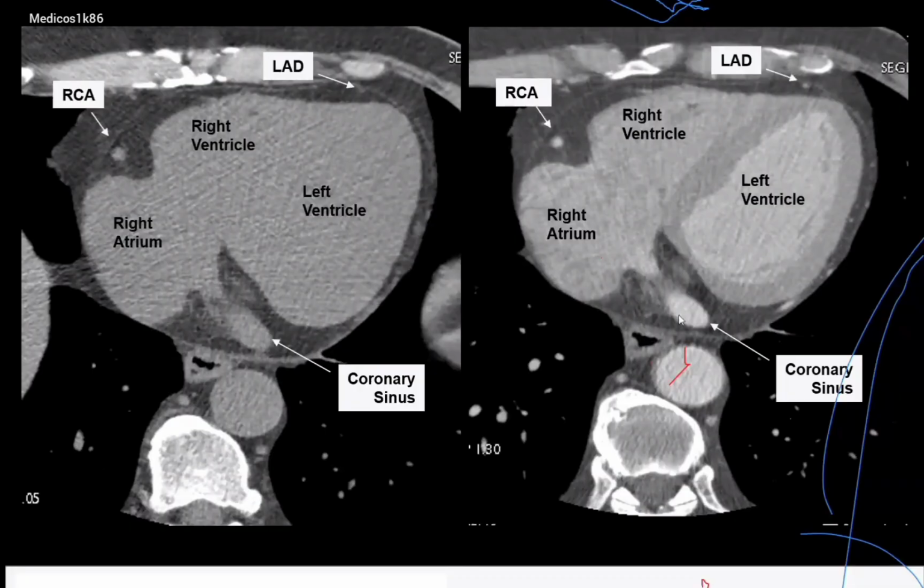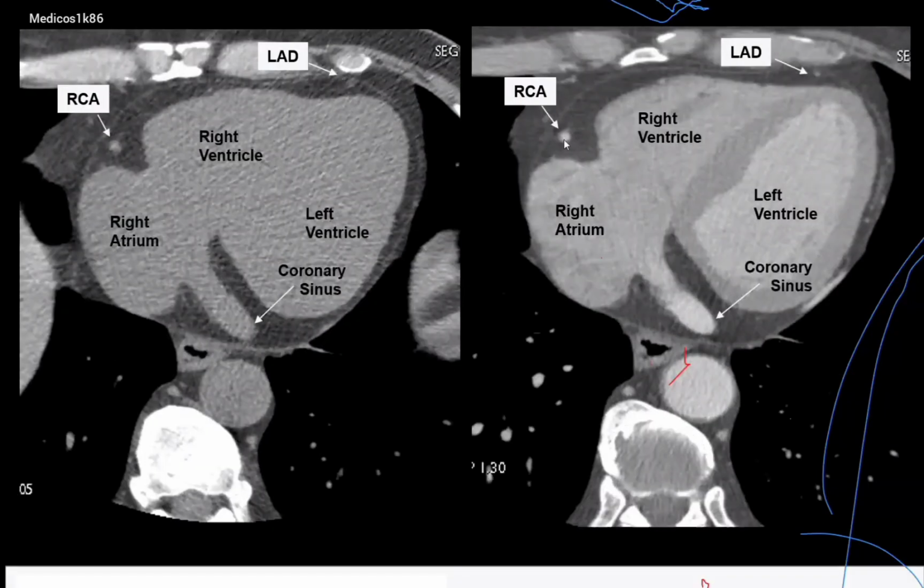Okay, this is the coronary sinus, coming from the pulmonary system and also cardiac, and going to the right atrium and then right ventricle, and then going to the pulmonary system again. Okay, this is the coronary sinus. All the carbon dioxide blood is coming to the coronary sinus. And the RCA is still running. And here is the marginal branch. You can see this is the long vessel, and LAD and RCA.